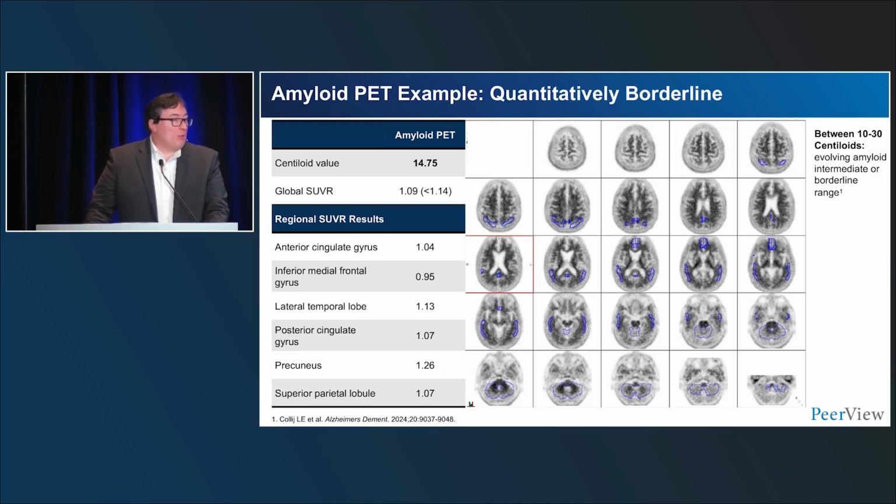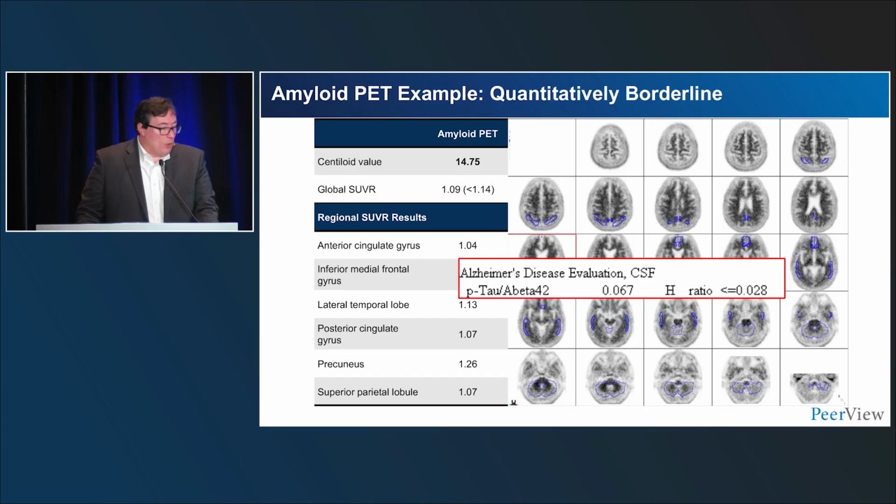And a clue that might support your quantitation is precuneus is a common early site of amyloid deposition. And you can see the SUVR of the precuneus stands out. And by looking at the ROIs, these look reasonable. So I don't think it's a technical artifact. That fits with my visual interpretation where it looked like cortex was in apposition. So overall, this is reasonable.